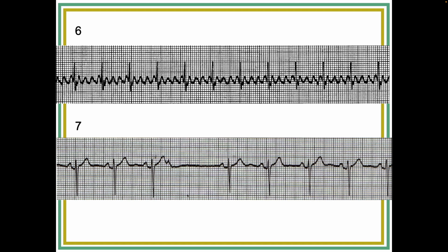Maybe it's just a normal sinus rhythm with a sinus pause. Okay, possibly, but then you have to tell me what that thing is. I have no idea. So first of all, T-wave. So let's march it out with the other P waves. How does it relate to the P waves? Is it in line with the P waves? Early, late? It's not in line with the P waves. It's early.